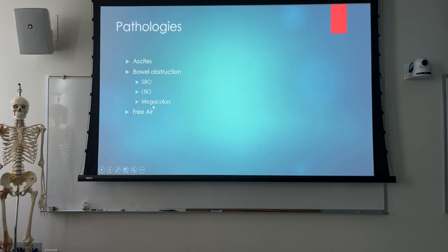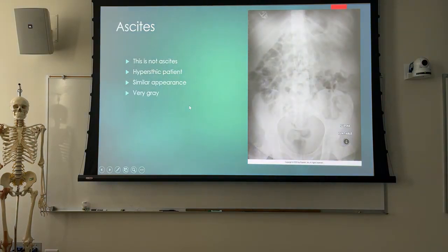She's not even here. She was asking about megacolon the other day, and then we're going to look for free air as well.